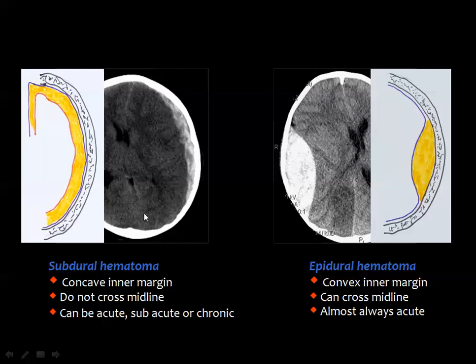The epidural blood is present in a tight space, so it cannot progress superiorly nor inferiorly, but it progresses in its middle aspect. Then you get the fusiform configuration.